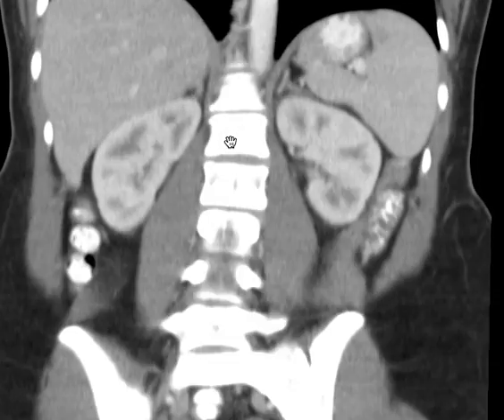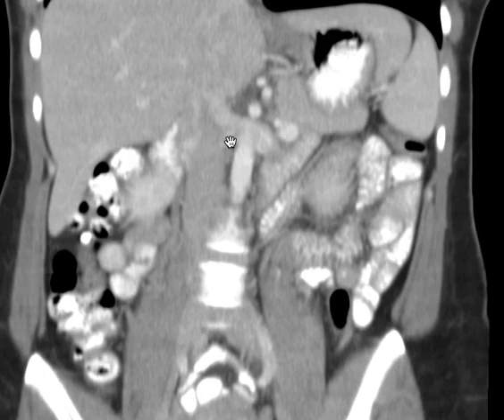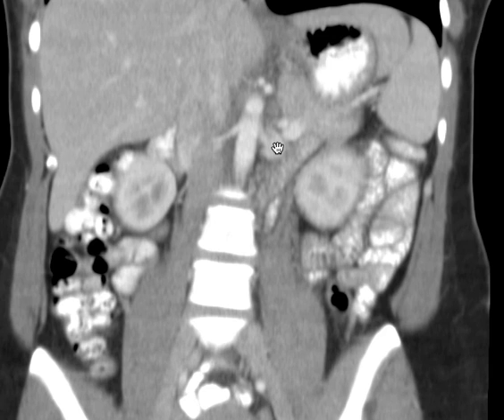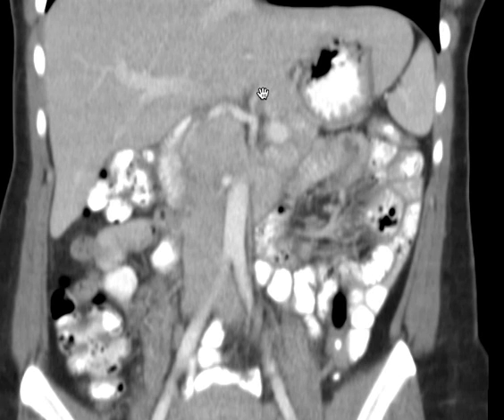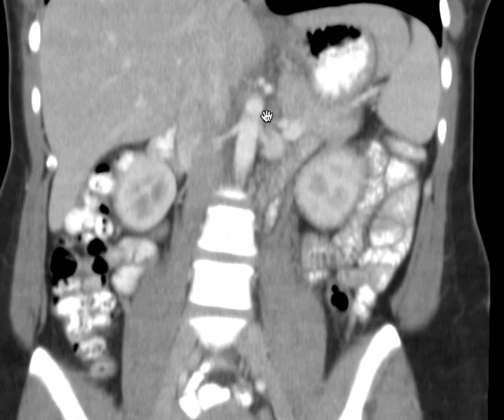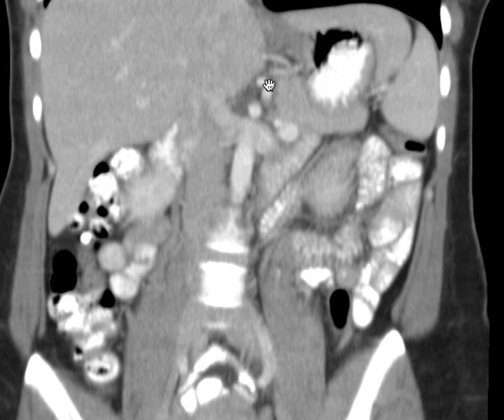Okay, and you see the kidneys here, and then just for some big structures. I know a lot of you are very comfortable with some aspects of cross-sectional imaging already. Here is the aorta, right and left renal artery, and here is the proximal branch off the aorta, which is the celiac axis right here.